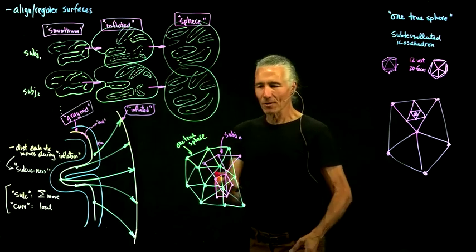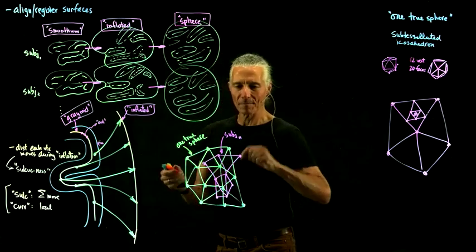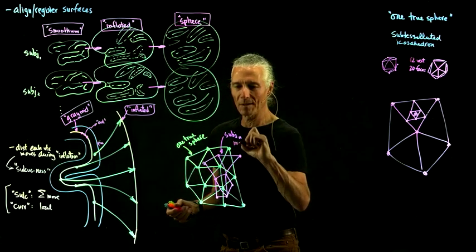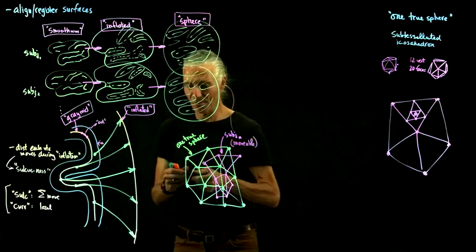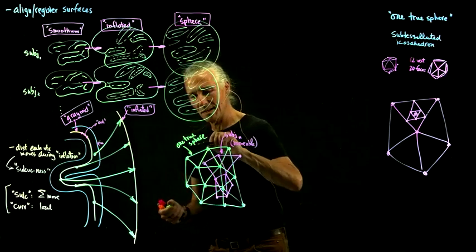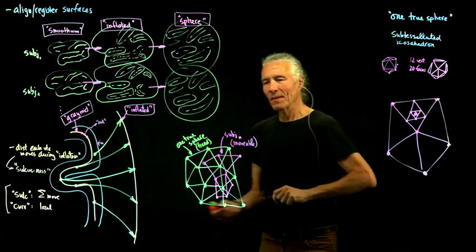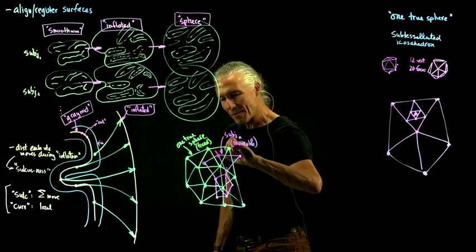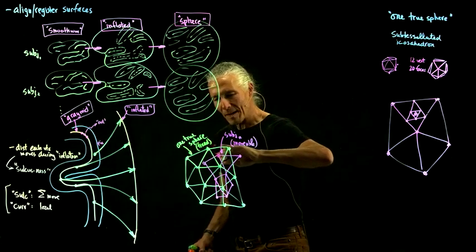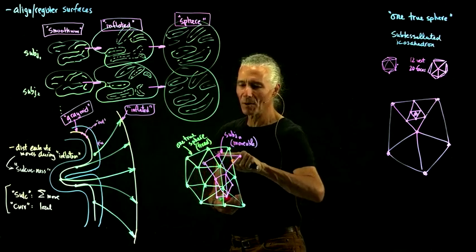So basically all you do is, so in words, what are you doing? Subject N is movable, and the one true sphere is fixed. So basically what you want to do is go in whatever direction you need to make this vertex have its sulcus measure be more similar to the target.